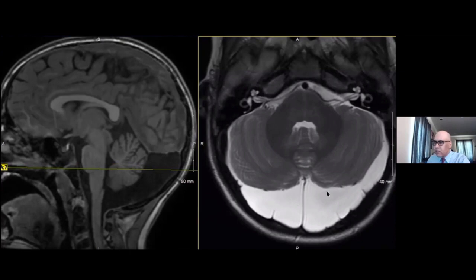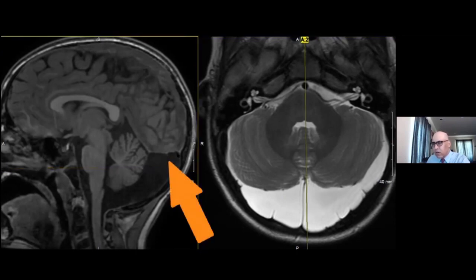There is no significant mass effect upon the cerebellum. I think this more likely is, given the absence of contour abnormality, just chronic remodeling and chronic slight expansion of the posterior cranial fossa. We also see chronic elevation of the torcula and the superior angulation of the posterior aspect of the straight sinus related to this. So this is a retrovermian arachnoid cyst that's also infravermian, but there is no Dandy Walker spectrum malformation. So that's very important that there is not a malformation.